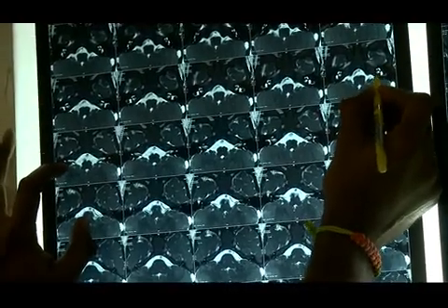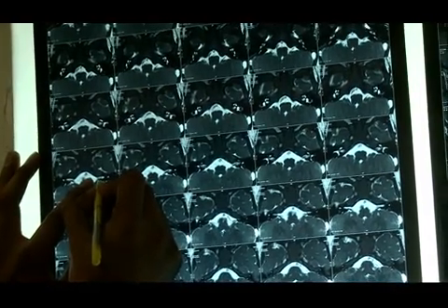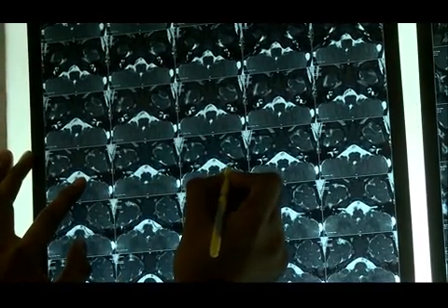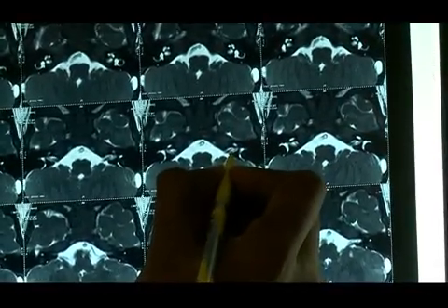So inferiorly this nerve going to the cochlea is the cochlear nerve, and on the other side, posteriorly, is the inferior vestibular nerve. As you go high up, you find the facial nerve. Now there is no cochlea in the view, and this is the facial nerve going on both sides. Can you see? Yes. And the superior vestibular nerve.